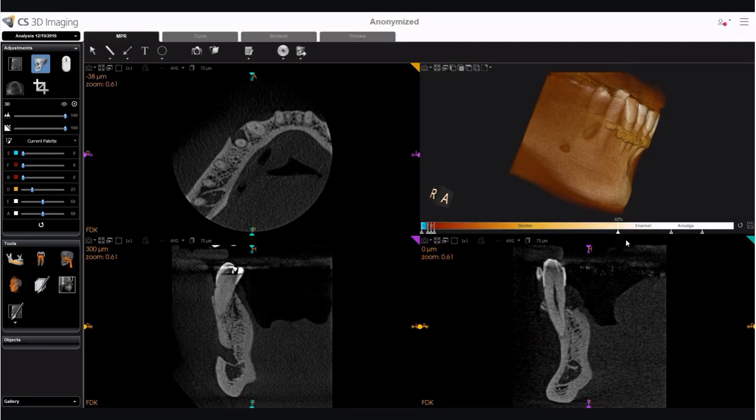Going from right back to the left, click and drag each slider to these general percentages: 90%, 80%, 70%, 40%, 25%, 10%, and 0%. These percentages might vary a bit either way to obtain the best 3D view.